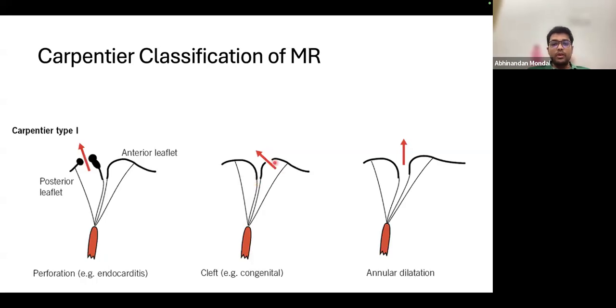First of all, always remember there is no indentation in the anterior mitral leaflet. So actual indentation is only in your posterior mitral leaflet. Another thing to mention is that indentation means there is a furrow, a groove, between the two scallops in your posterior mitral leaflet. If it covers more than 50% of the width of your leaflet, that is a cleft.